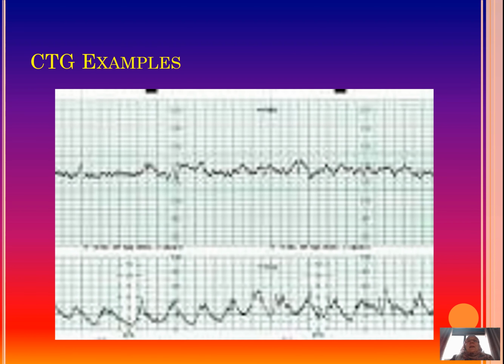So this is another example of a CTG. When we look at the contraction pattern, we see that this patient has sort of regular contractions, but they are quite frequent. You can count 7 contractions in 10 minutes. This is actually frequent, and it makes you wonder if they are more like tightenings rather than contractions. To distinguish this, you will have to have a feel of the contraction.